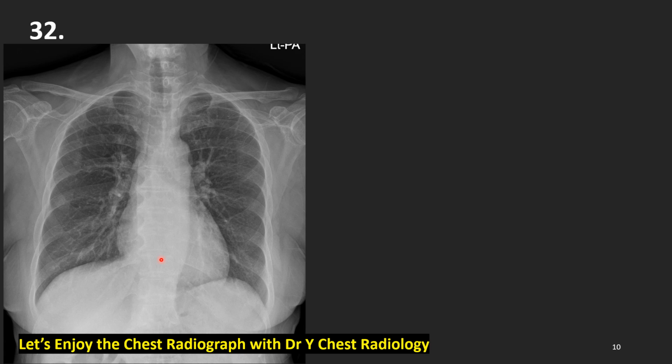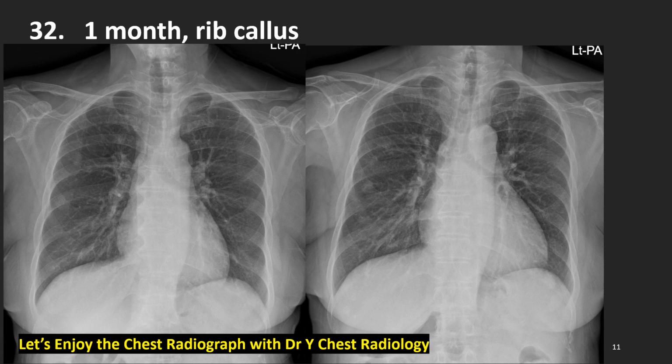You got it? What is your answer? Are you correct? Refracture with callus formation. One month after this film, we found this anterior rib, linear, focal bulging rib, sclerotic densities. That's it. Callus formation of rib fracture.